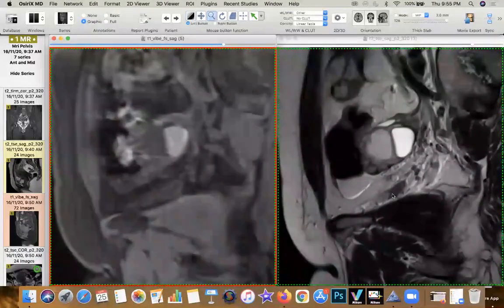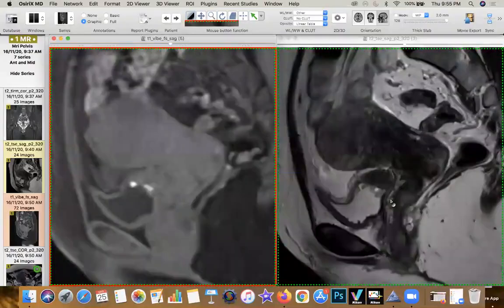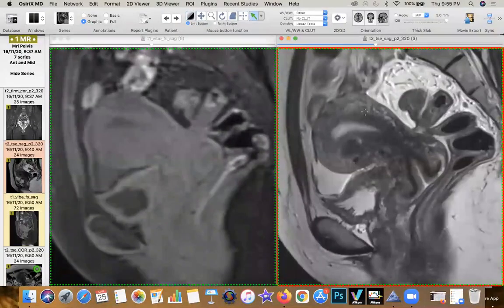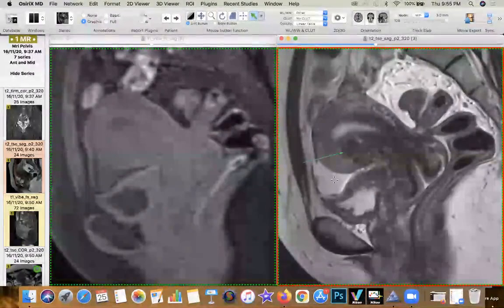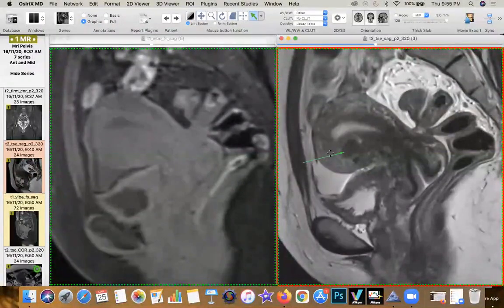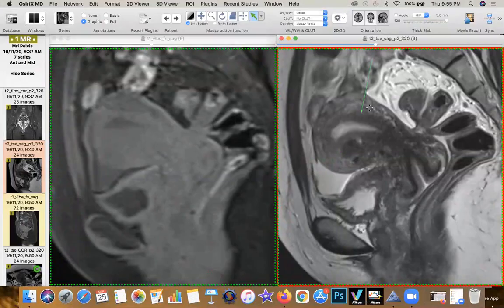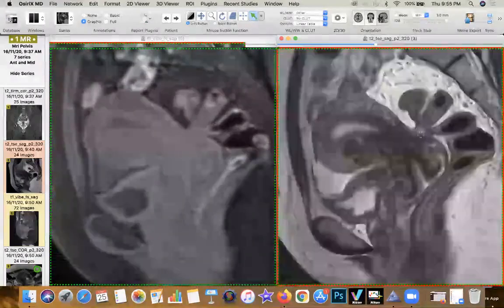That's a classic example. So look at the uterus per se. The uterus does have a normal morphology, but it has certain features which can tell you what the pathology is. This is a fibroid. That's a fibroid. You're not worried about those two because they're well circumscribed with a sharp zone of interface. You have a normal junctional zone, so you know this is not adenomyotic. But the first thing which comes to your mind is you look at what's happening along the posterior wall.